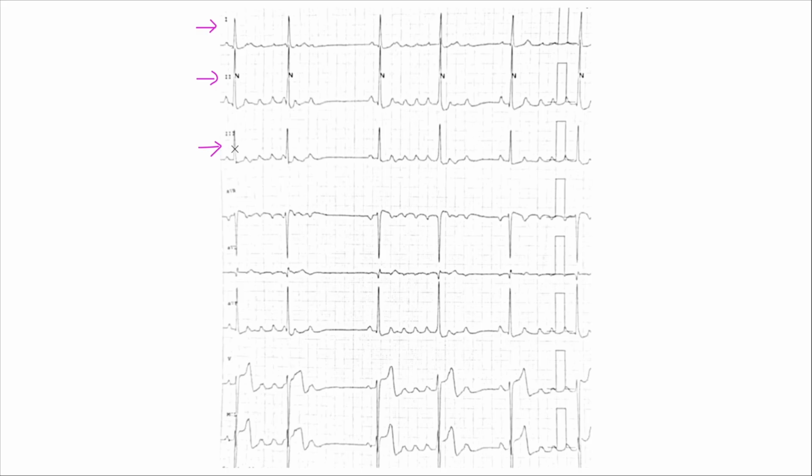See how much of a difference lead inversion has made? So a couple hours later, this patient was placed, well, this was not a 12 lead, right? Here we're looking at lead 1, 2, 3, the augments, AVR, AVL, AVF, and then we have a couple of modified chest leads. This is lead V and MCL. Typically, they're assigned to monitor V1 and V5.